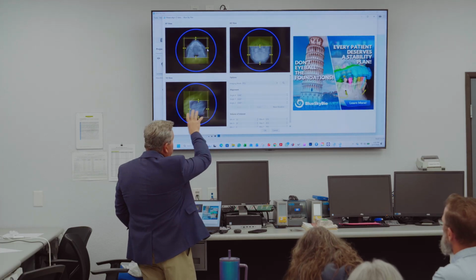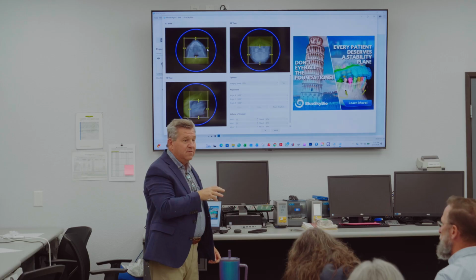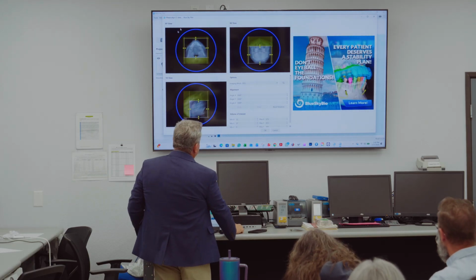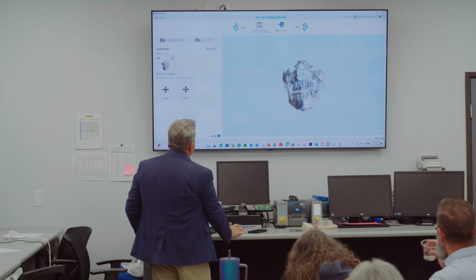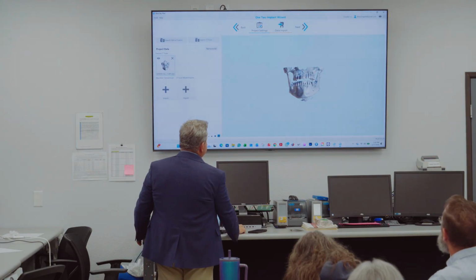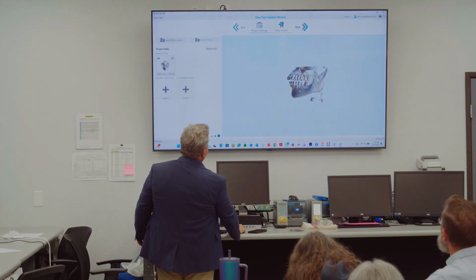All right, we got our files trimmed up. We good? Yeah? Thumbs up? Okay, so click OK. All right, gives just a little preview there. That's what the cleaned up version should look like, okay? And we're going to click Next.